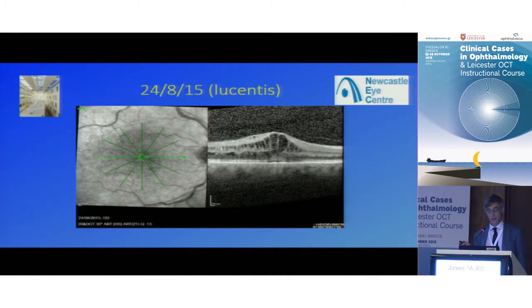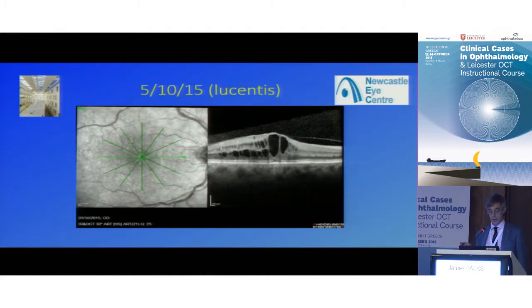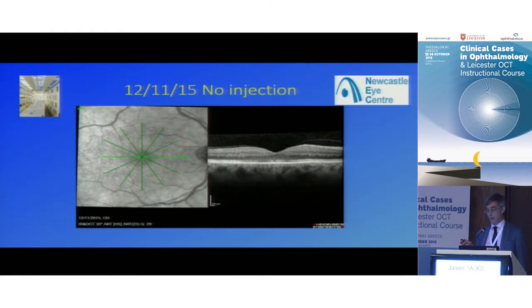So this is 2015, August. We injected them, come back, actually there's still fluid, so we keep injecting them. November, it's gone. But that isn't the end, is it? We know that is not the end.